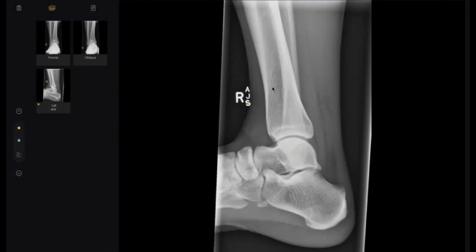Okay. This is the lateral X-ray projection of the right ankle, in a patient who presented with sudden severe pain, in which I can appreciate that in the line of the Achilles tendon, there is some density seen in its middle part, just above the attachment. If the patient has presented with sudden severe pain, and in the retrocalcaneal region in the Achilles tendon there's hyperdensity, I will correlate with ultrasound findings to rule out Achilles tendon tear.